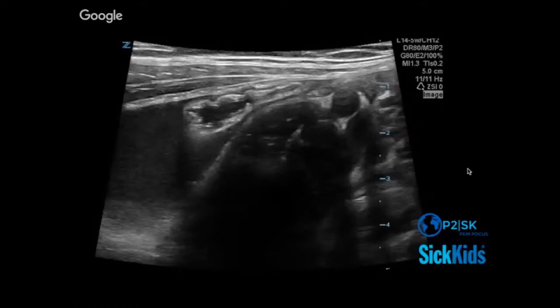Okay, let's start with the still image. What's this? Yeah, iliac vessels. This? Could that be the appendix? Kind of like on the right, yes, on the left. So I think it's terminal ileum, making the jump over. And I think that just out of experience, I guess. And then this.